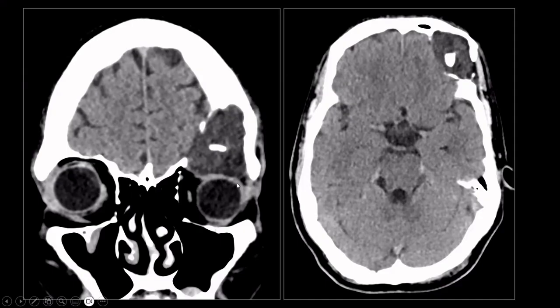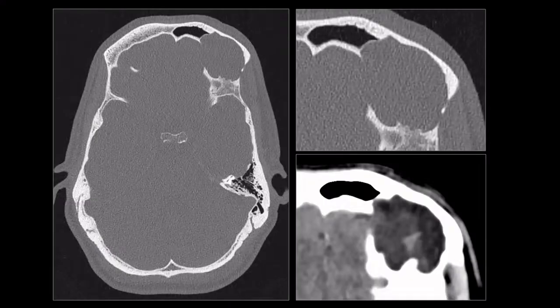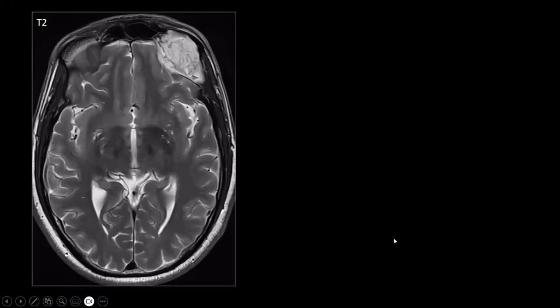This was a patient with a slowly progressive chronic proptosis, and on bony coronal images, we see that there is bony erosion, but it looks still rather benign. There is scalloping of the bone over here, so this looks like slowly progressive chronic pressure erosion of the bone. And on the soft tissue kernel, the lesion seems to have a fluid-like hypodense content.